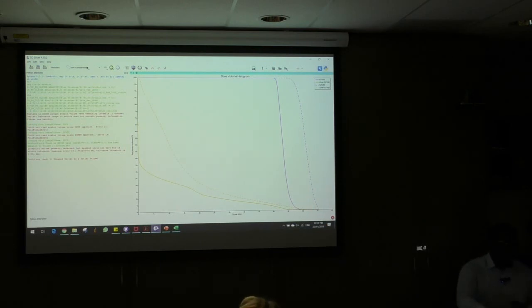And there's also a MATLAB bridge in Slicer. So you can download this MATLAB bridge and use MATLAB to interact with the Slicer environment. So Slicer is very robust in that it can allow you to use Python, MATLAB, or C++. One of the things I looked into doing during my project was, like I said, to modify the Slicer source code to try and implement ion plans and IMRT plans.